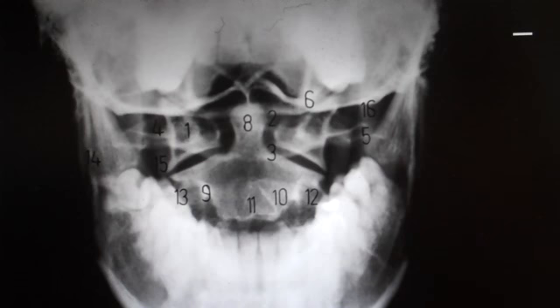Now, number 6 in the book is labeling the occipital atlanto joint. The joint is this space right here between this lateral mass and this occipital condyle, and you can just barely see this little dark slanted articulation. It's just a barely slanted, thin dark line right along right here. If I go over to this side, you can see it a little bit better, that little thin dark line right along right there.